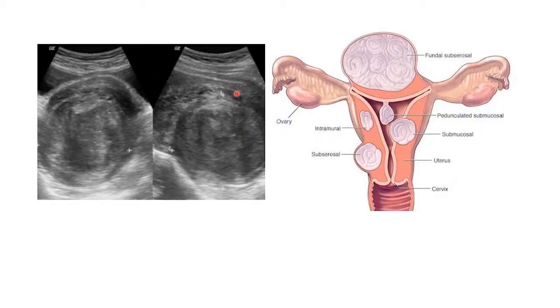It is this mass effect of the fibroids which normally causes infertility, or it can push and cause an ectopic pregnancy. So those are some of the dangers of trying to conceive when you have got fibroids before they are managed. Either the fibroid will compete for space with the incoming baby and cause a miscarriage, or it can block fertilization totally by blocking sperm movement, and then that can cause infertility. So these ones are a going concern in gynecological practice. So this is the same type of fibroids again, the different types of fibroids that I spoke of.